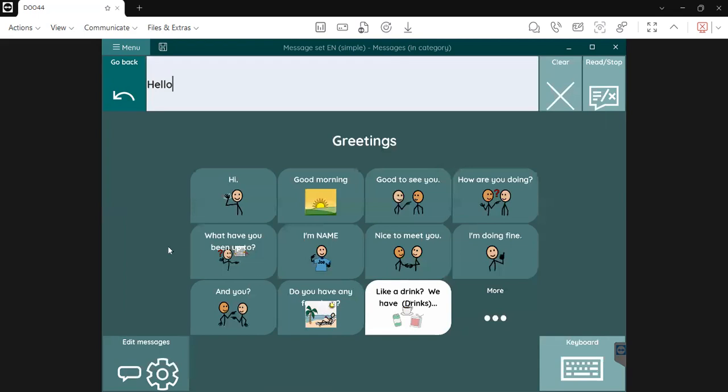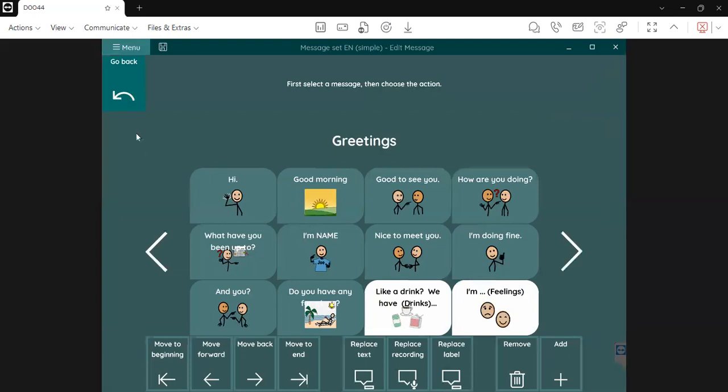One more thing I'm going to do is connect this message set page set that my patient wants to use with their iWorld page set, which is something else that they might want to use. So I'm going to access this go back button, back again.